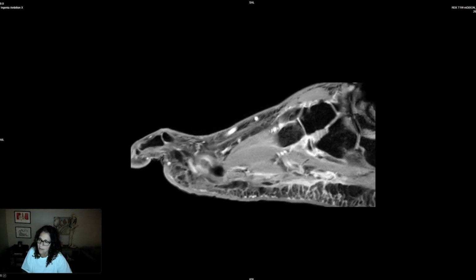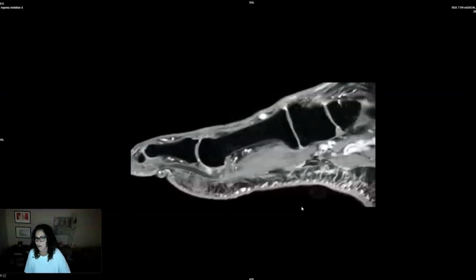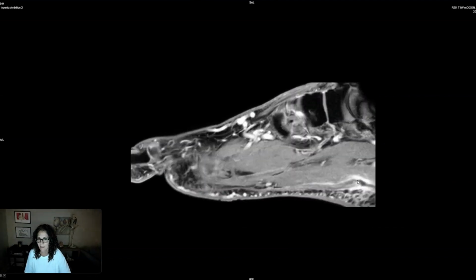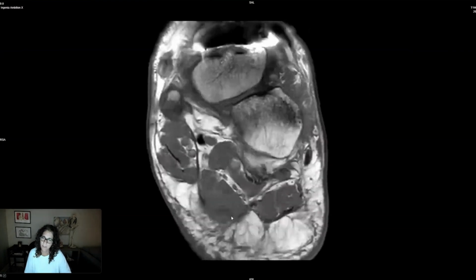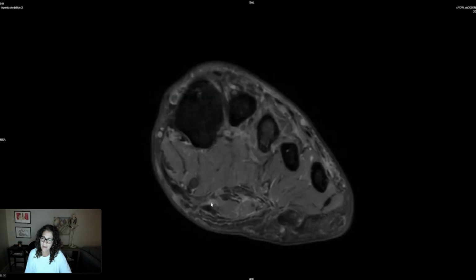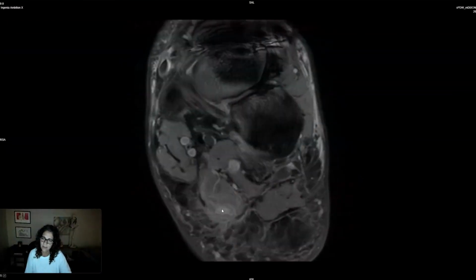And what else can I show that with? This can show us this particular area, but I think that you're having a plantar fibroma. There may be a partial tear. And I would like to see this in a sagittal STIR, if anything, so I could really be sure of what I'm seeing. But to my eye, there's quite a lot of edema. It's wavy and lax, and I am pretty sure there's going to be a high-grade partial tear in that location. I want to take back high-grade partial tear. I see a lot of inflammation around it, but I don't, and I do see this elevated signal.